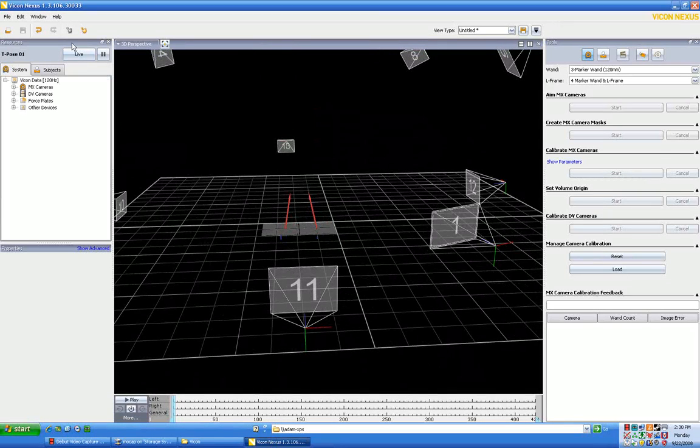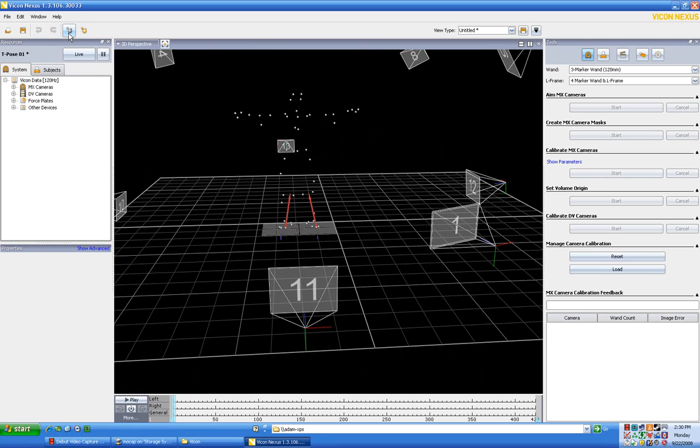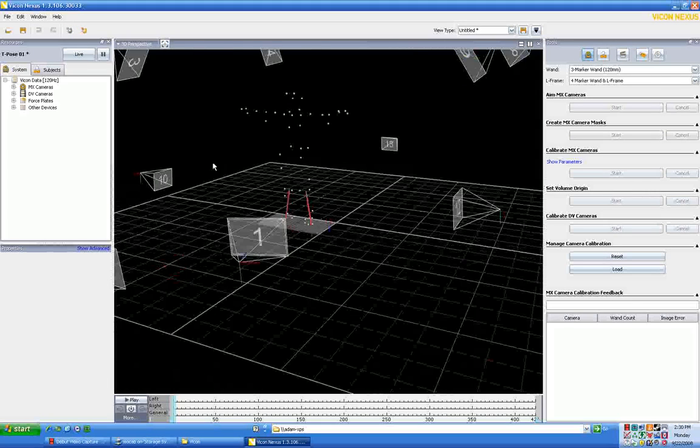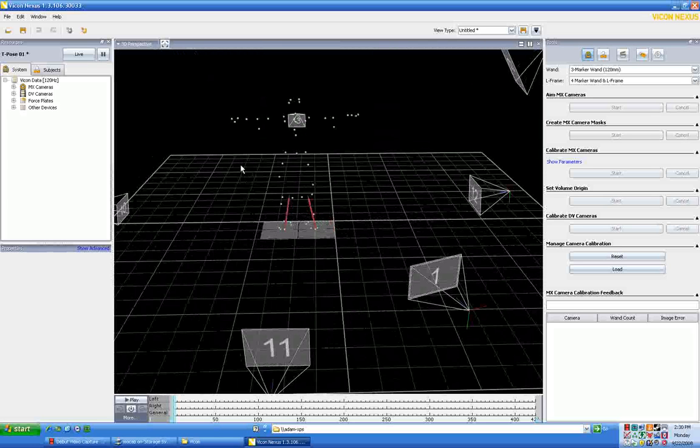The first thing that we want to do is reconstruct. We want to run the Reconstruct Pipeline. There's a number of ways to do this. The easiest way, however, and the way that I want you to do it, is to go up here and click these gray dots. When you do that, you'll see that you run the pipeline and that the dots will indeed be found as I rotate the camera around here. The dots will be found from the person.